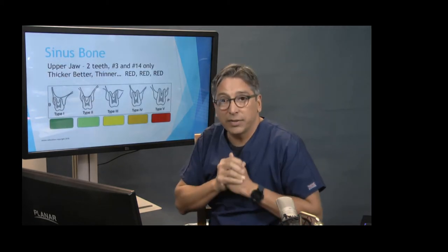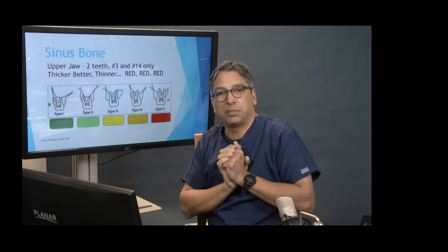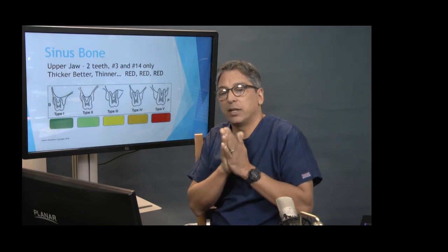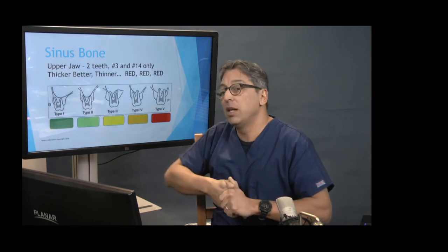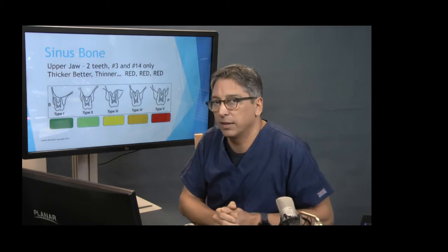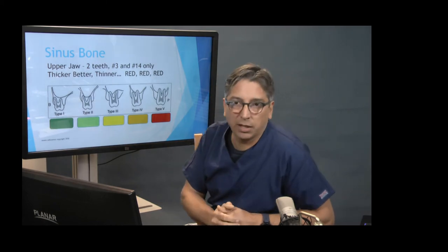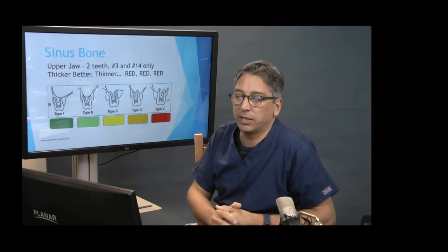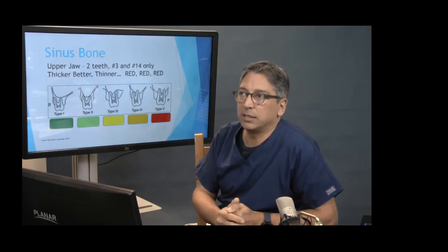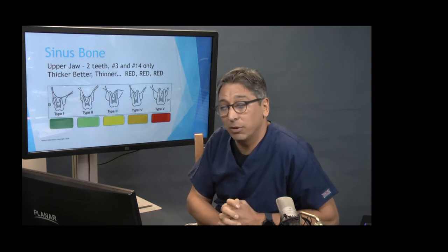Sinus bone, you definitely want a CT to look at the sinus bone. Sometimes you can tell on a regular thing, but there are categories of sinus bone, and we want to see this before we take the tooth out if you can. Some people are already missing teeth in the upper first molar area, then it's very clear how much sinus bone you have. This is more about, let's look at it when you have teeth and when you extract teeth.